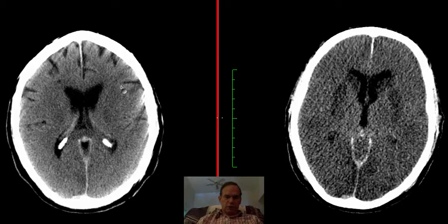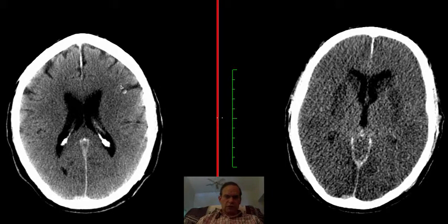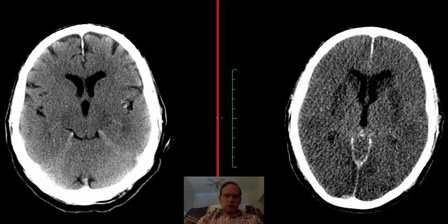We have a lot of beam hardening artifact here. The patient was obviously unable to cooperate well. We do see a thin, high attenuation area, a ribbon-like structure in the cortex, which indicates the normal expected distribution of attenuation in cortex, with a thin, higher attenuation cortical area and a lower attenuation grayer area of white matter.